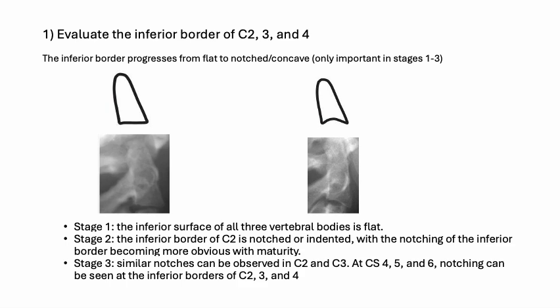And so it has been shown, and you'll see in several examples later, that the concavity will develop on the inferior surface of the vertebral bodies sometimes independently of the ring apophyses, but once the ring apophyses fuse, then that concavity becomes very pronounced. But according to the initial description, you're supposed to disregard the presence or absence of a ring apophysis when you assess the concavity or convexity or flatness of the inferior border.